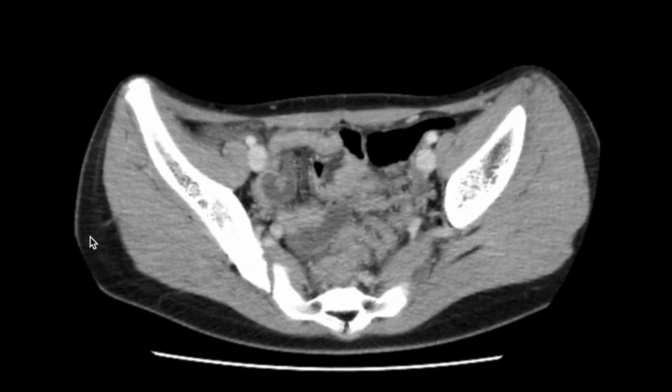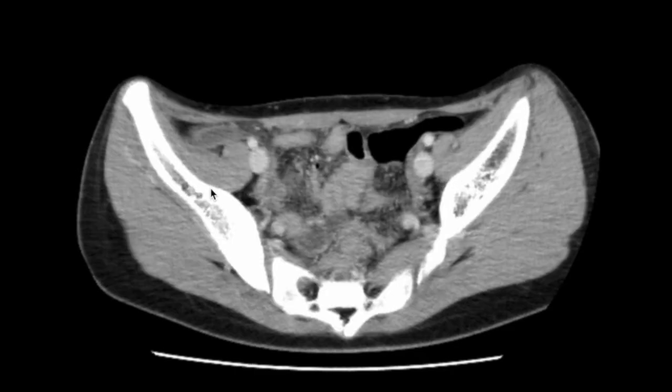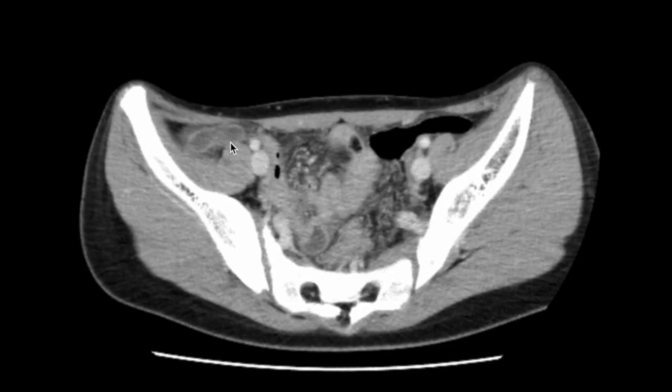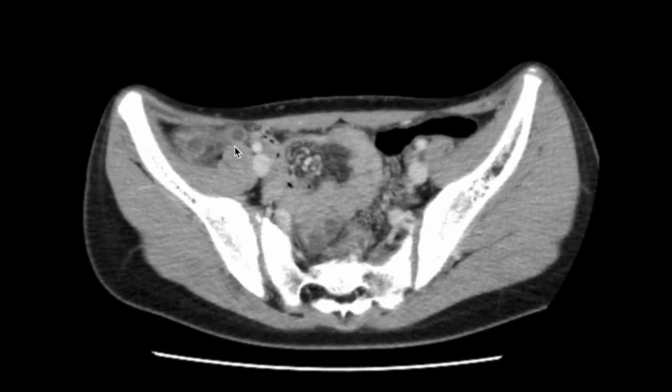On CT, fat appears black, bone appears white, and water is somewhere in between. So this gray tone tells us the lumen is filled with water-like fluid. If gas were trapped inside, the lumen would look black. By contrast, the appendiceal wall consists of tissue, mucosa, muscle, and so on, so regardless of the luminal contents, it's a soft tissue structure. When appendicitis develops, the appendix becomes enlarged and the wall thickens. In this image, you can clearly see the appendiceal wall thickened by the inflammation.